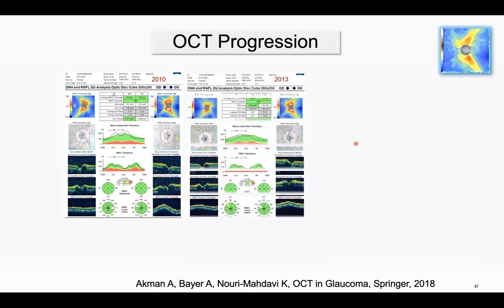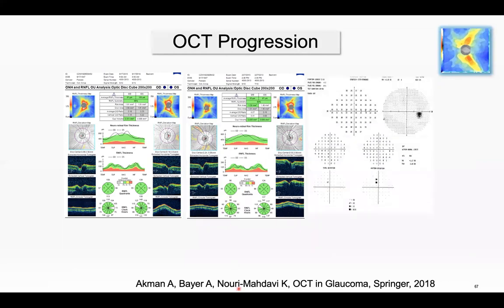In her 2013 OCT, there are just a few clues about glaucomatous damage, but it's nearly normal, green range, only a dent here. You can see it here, and it's yellow. And the Humphrey visual field of the right eye was completely normal.